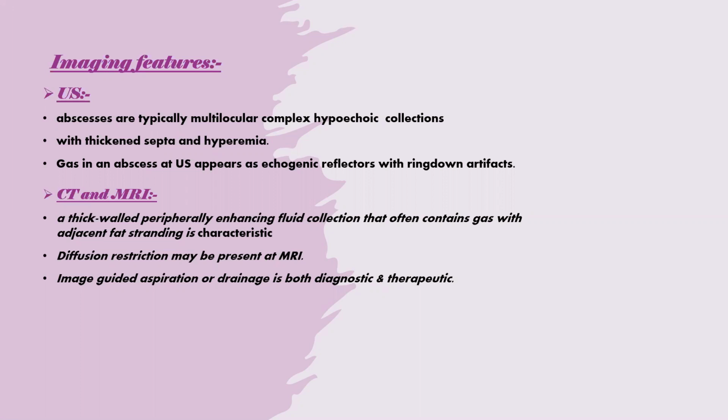Gas in an abscess at ultrasound appears as echogenic reflectors with ring-down artifacts. By CT and MRI, a thick-walled peripherally enhancing fluid collection that often contains gas with adjacent fat stranding is characteristic. Diffusion restriction may be present on MRI. Image-guided aspiration or drainage is both diagnostic and therapeutic.